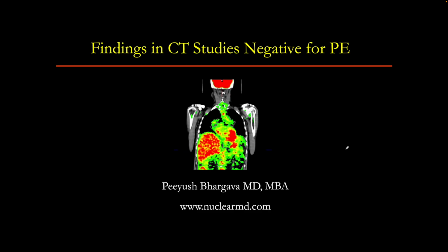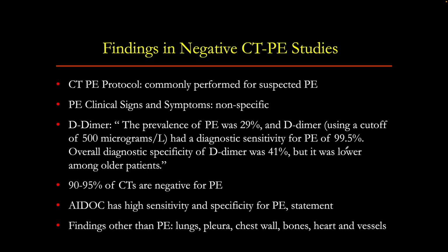Hi, this is Dr. Bhargava, and this video is about findings on CT studies negative for acute pulmonary embolism. So, CT-PE protocol is a very commonly performed CT, especially in patients who are suspected of having an acute pulmonary embolism from the ER or on inpatients.